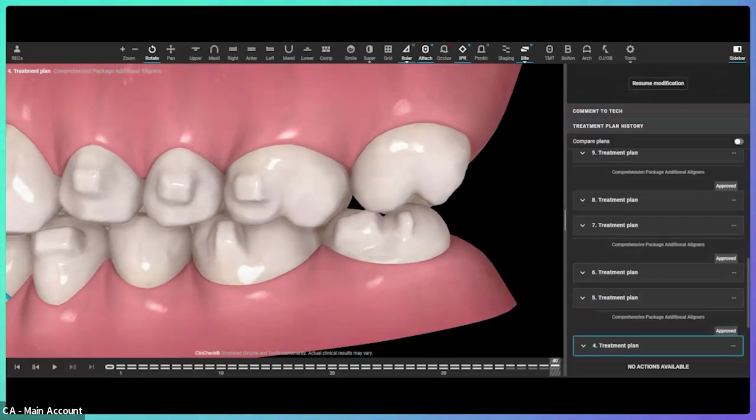Okay, so that's the plan. In terms of the actual results of what we get, well, here's the plan. Let me show you.